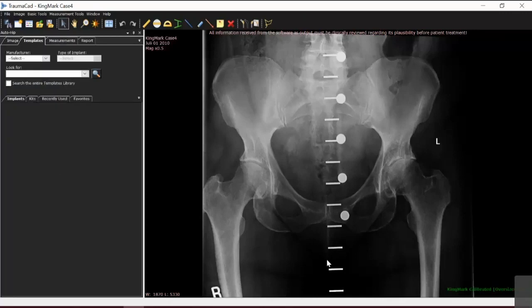And for this particular patient, it said the radiographic magnification is 13%. And as you know, you would expect that figure to be anywhere from 10% to 30%, but the average will be around 15 or 20%. Okay, so we can now confidently know that when we measure anything on this image, it is life size.